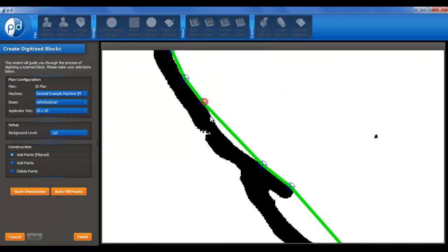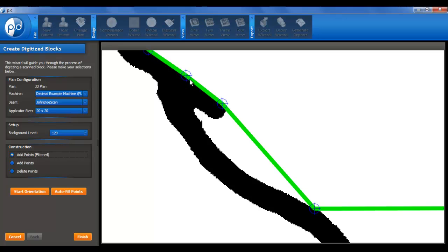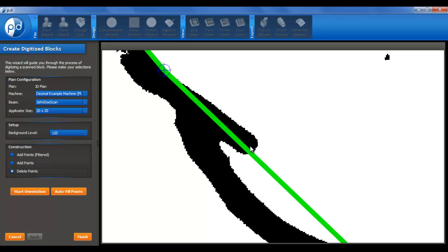Need to get a couple more over in this region. And here, I need to make sure that I communicate with the drawer of this contour. What do I do where these two lines kind of diverge here? Well, I've communicated with that person that this inside was just kind of a goof up, that they didn't erase.